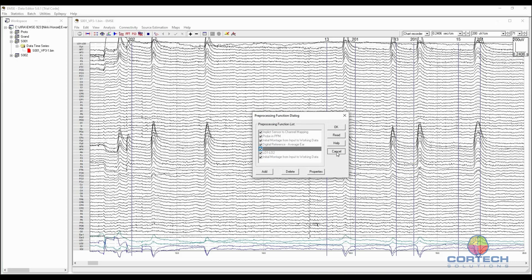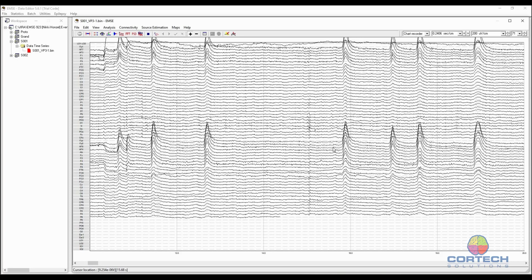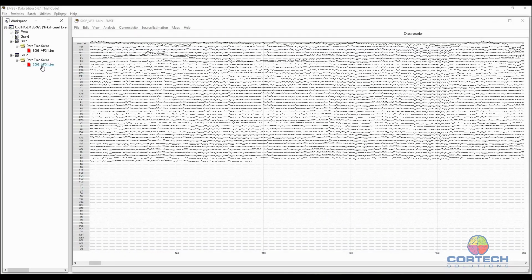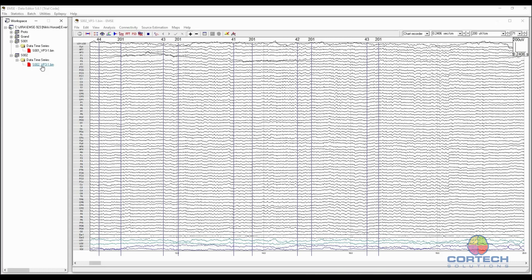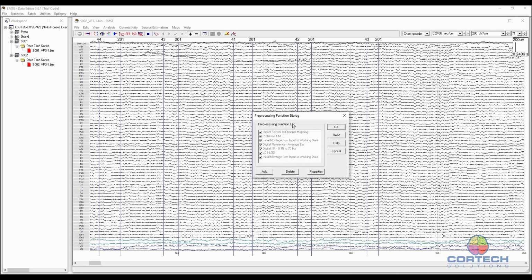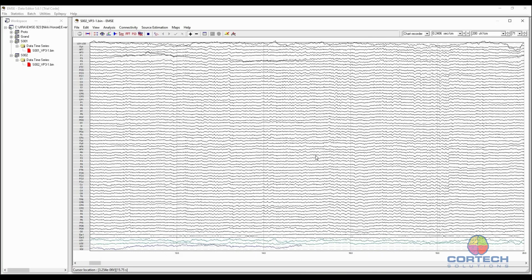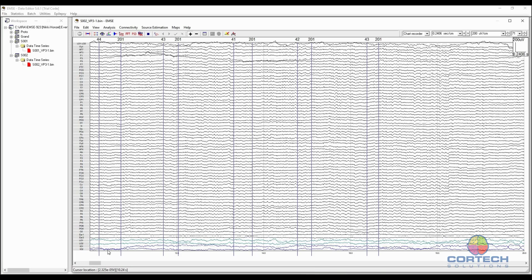All right, and the same thing for subject 2, which happens to be Lloyd's data. So I'll just double click on that one. Okay, so Lloyd doesn't have as many blinks in his data, but you'll notice all the same filters have been applied to Lloyd's, and the display preferences carried over, as noted by the channel colors here.